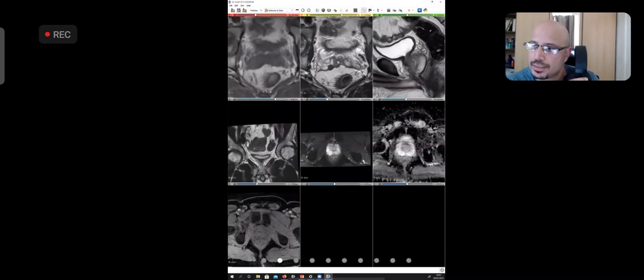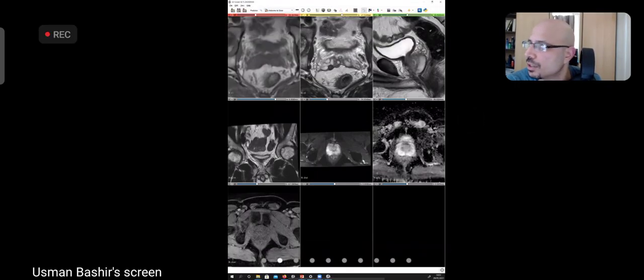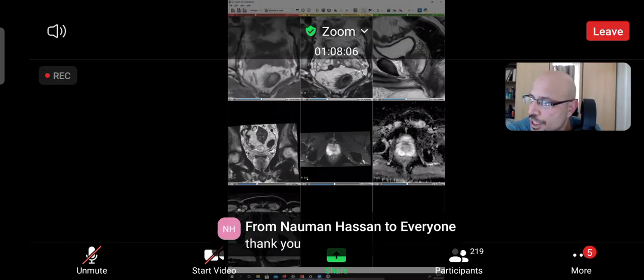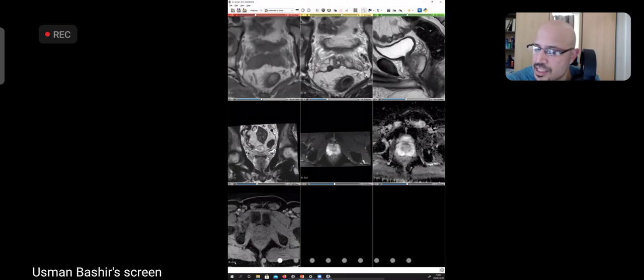One, two, three, four. This one is the coronal T2 weighted sequence. Does that answer your question? And I've written it on all of them: T1 axial, T2 axial below, so when you later review the video you can look at that. T2 sagittal, T2 coronal, DWI, ADC, DCE. Ignore the typos in DCE. You can look at this in the slides.